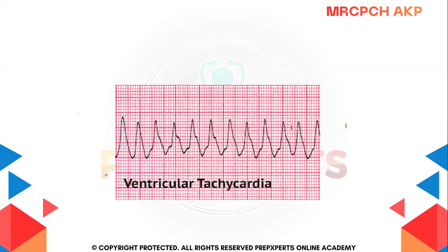Can you appreciate these little mountains? You will see these mountains whenever you get them in the exam. There's no need to go deep into whether it is 120 milliseconds or not, or to calculate. Just have an idea: Google it, look at all the pictures on Google or in your books. Just go through ventricular tachycardia pictures.